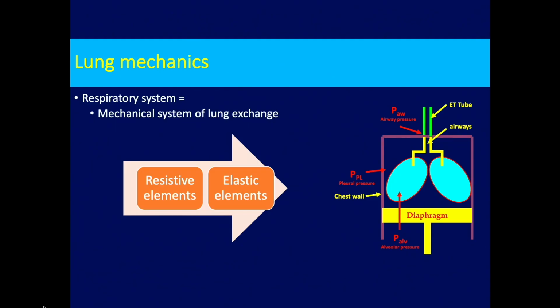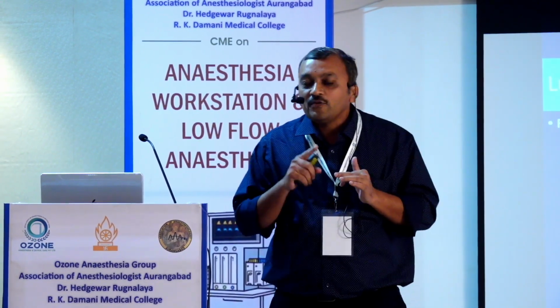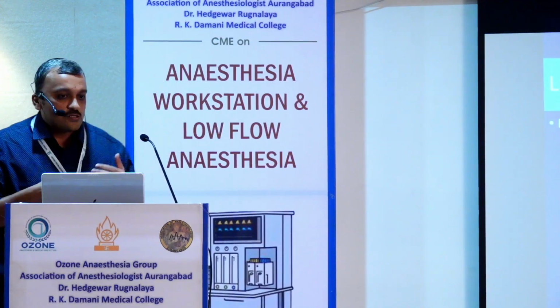Now let's talk a little bit about compliance and resistance. We all need to understand this. It's a very straightforward thing. But in your machines, especially the new workstations, you will have this compliance, you will have this resistance, static compliance and dynamic compliance. So what are these things?